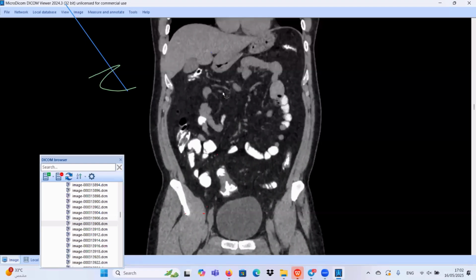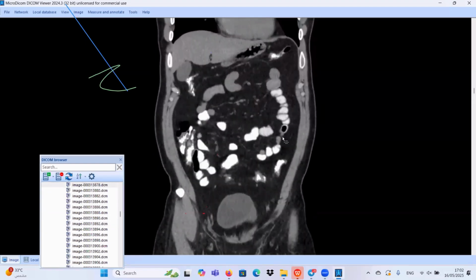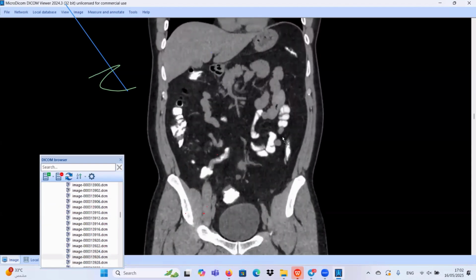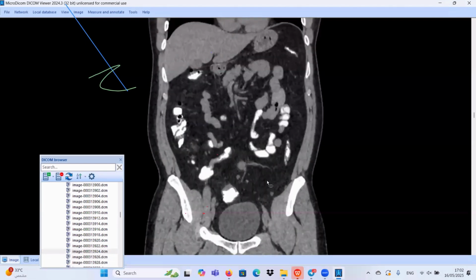Sir, how can we differentiate between a lymph node and another mass in the mesentery itself? Maybe an extra-adrenal pheochromocytoma, or a sympathetic chain tumor. You are right, but we have two lesions, not one. And when we inject the contrast media, you will see the core of the lesion is necrotic. It's very characteristic.